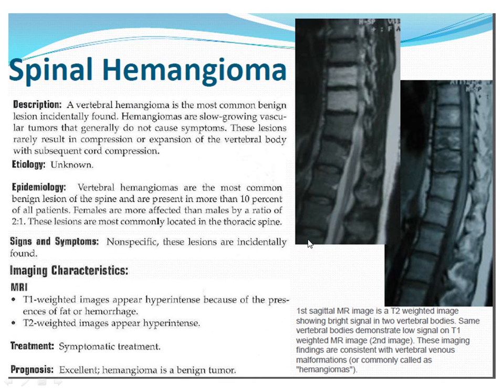So a spinal hemangioma, it sounds like a tumor, but it's a benign tumor. It's a benign lesion. We see them really, really frequently, especially the amount of imaging that we do. You can see them both on CT and MRI. They can look really scary at first. They can look like something serious. It's very bright on T1 weighted image and bright on T2 weighted image.